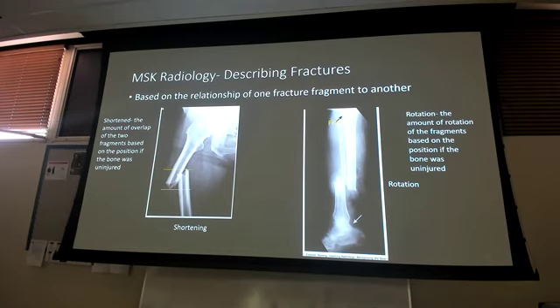So that's where rotation would come into play in describing this one. Yes, sir? So then we call it like transverse medial rotation linear. So probably lateral rotation, because it's pointed out towards the lateral side. I would want the other picture, but I could see where you would get away with transverse fractures of the tibia fibula with lateral rotation 90 degrees. Again, we're aiming which way it's pointing, so it's out this way.